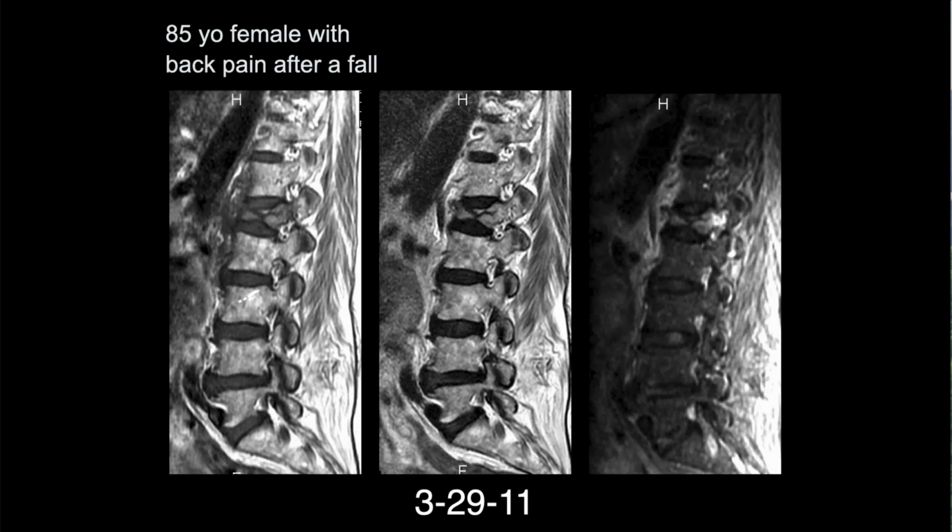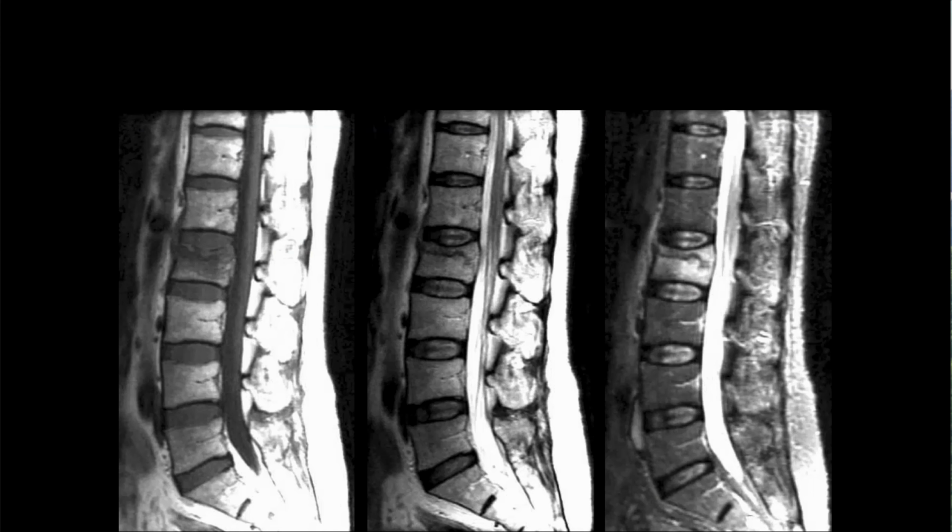Would you watch it? I wouldn't redo imaging unless the patient's clinical course unexpectedly got worse. As a clinician, I think I'd have the patient come back in a month or so and keep checking. It may be completely just a compression fracture, but the bulge always bothers me. Good.